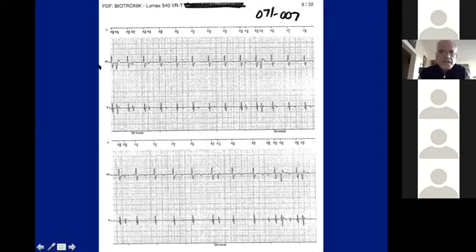It says far field, so this is basically your leadless ECG, and this is the ventricular local signal. These look like QRSs, right? But between the QRSs there is something, and there are more markers indicating that the device is actually seeing that. Down at the bottom, you have even more. Is this a real thing or is it noise? What do you think?